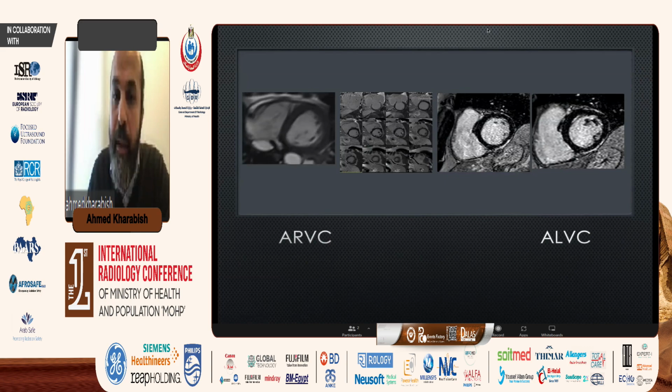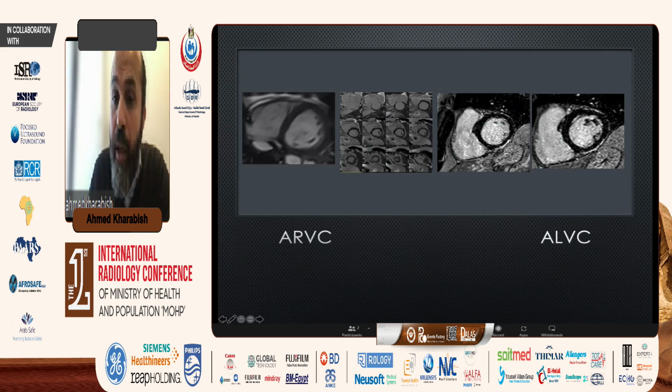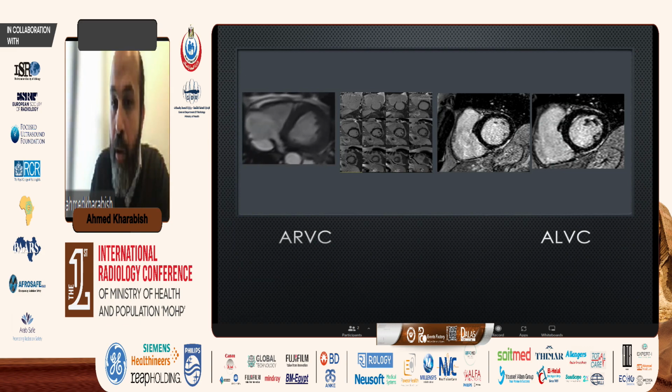ALVC usually presents on imaging by enhancement that is subepicardial, and usually it's along the inferior wall. Sometimes it is circumferential, similar to this case, and sometimes it goes to the septum, and this sign is absent in athlete heart syndrome, where there is no fibrosis detected.